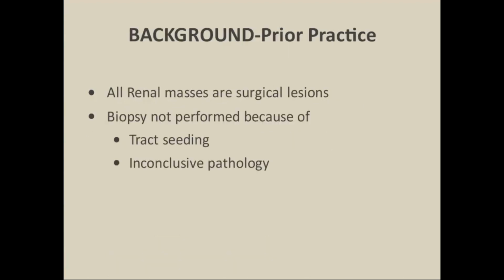Prior practice was certainly one where we said that every renal mass, every solid renal mass, was a surgical lesion. And we didn't biopsy those, though.